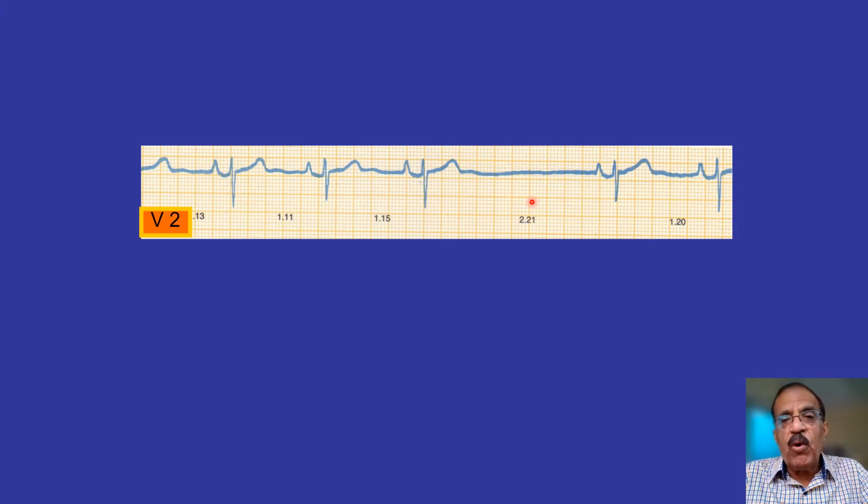Only when it depolarizes the atrium, it produces P wave, and when the same current goes into the ventricle, it produces ventricular depolarization. Sinus node activity within the SA node does not produce any ECG change. So we don't know whether sinus node activity occurred and didn't come out, or it did not occur. But there is a way to find out. I'll show you very shortly.